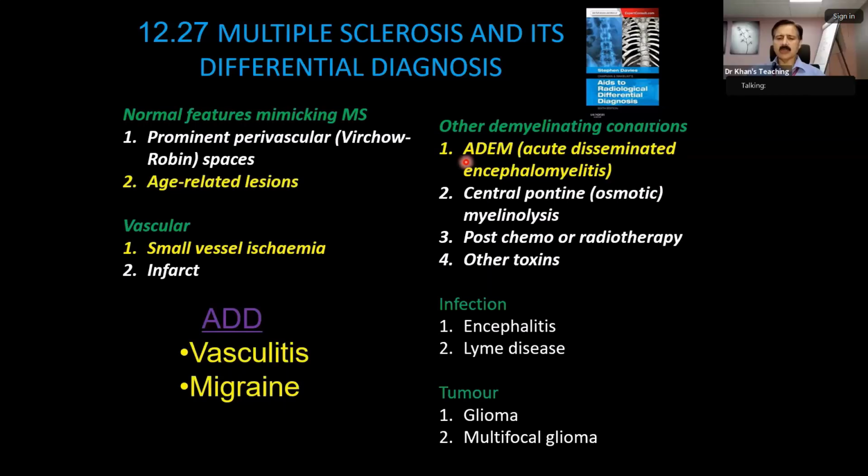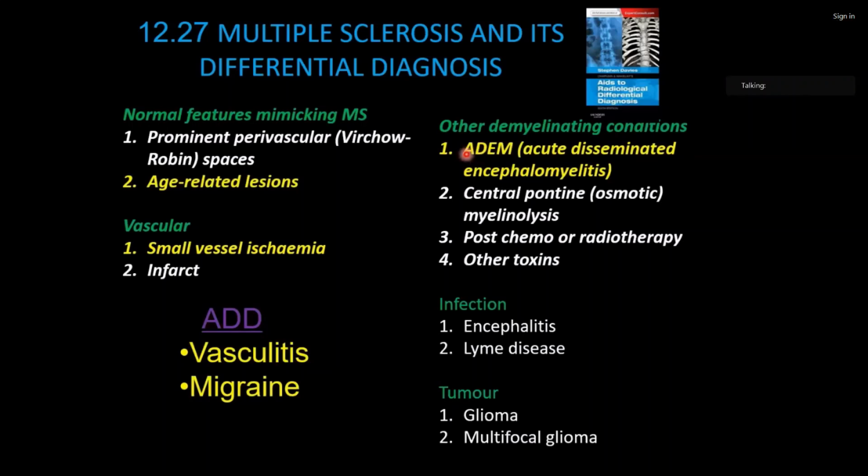So in the real world, you will always consider in your differential, part of the differential is clinical, which we will learn. But please remember that radiologically speaking, there are differences, and these differences will be asked in the exam. So I'll show you cases highlighting the differences.